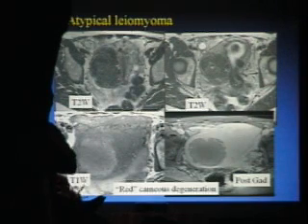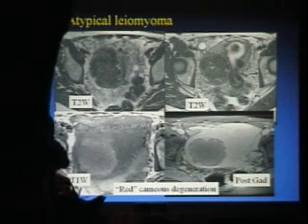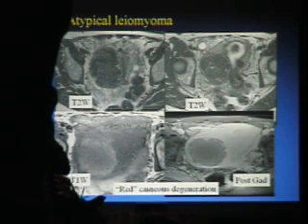Atypical leiomyomas can look like this. On T2, we start off looking fairly normal. We've got a large, well-defined, low-signal T2 mass in the myometrium. Another one here, T2. And there you've got a submucosal one. But then we go to T1, and we see this really high signal stuff. And we begin to think this is not a fibroid after all, maybe.